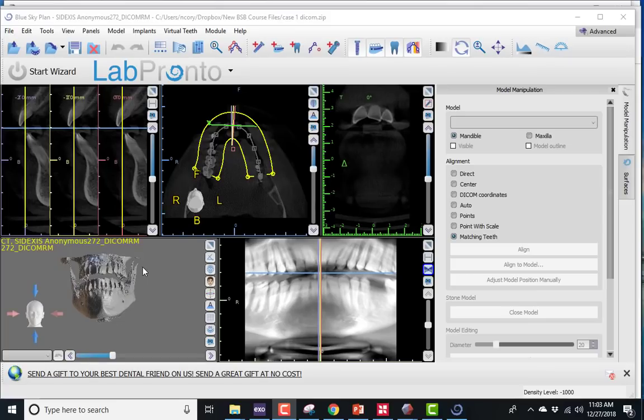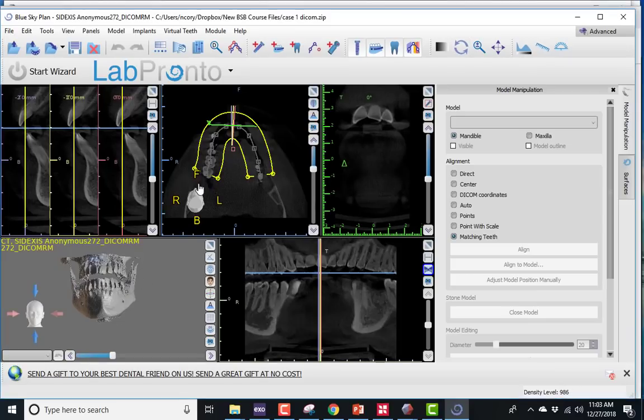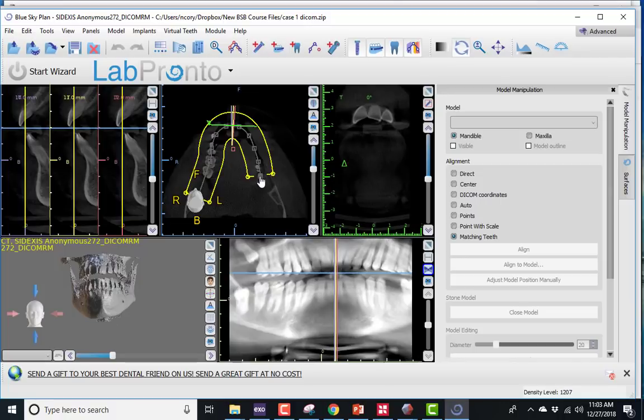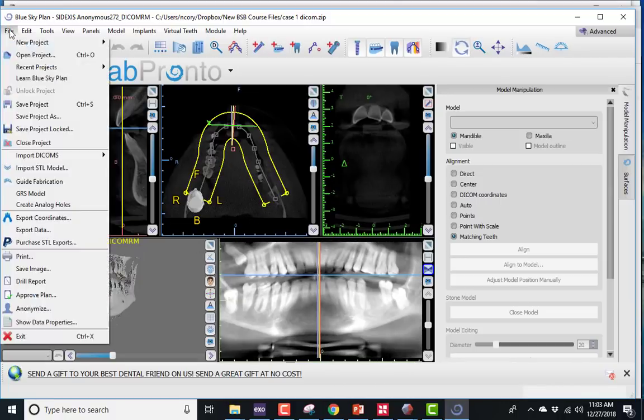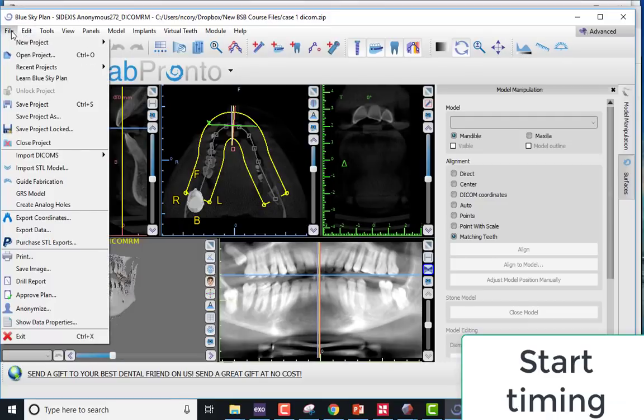Hey, this is Corey Glenn, and I'm going to do a live demo here where I'm testing out the new automatic STL alignment feature. This is actually the first time I've used it, and I do these videos typically for development testing, and just thought it'd be worth sharing with everyone.